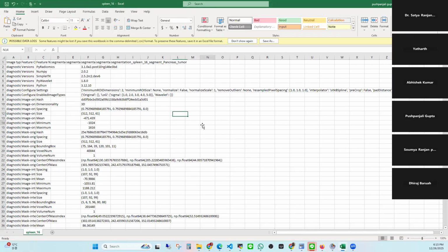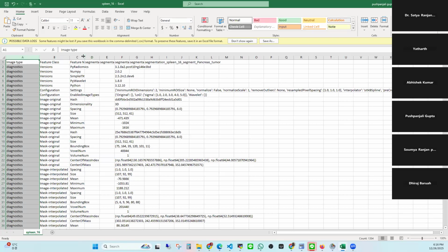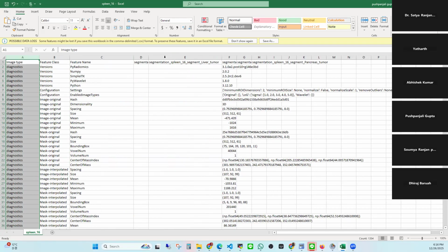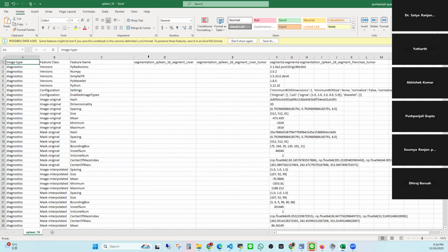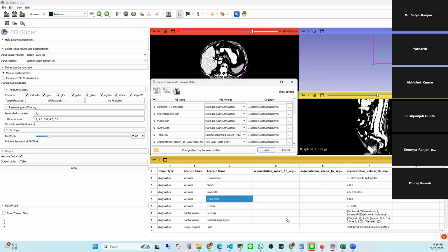Okay, so these are the features we have extracted. You can see there were 1354 features over here. But like I mentioned, not all the features extracted might be useful. Some are kind of metadata, and you can see we had 5 classes. Okay, we'll see this one, and also I'll go back to the 3D Slicer to explain some part here.